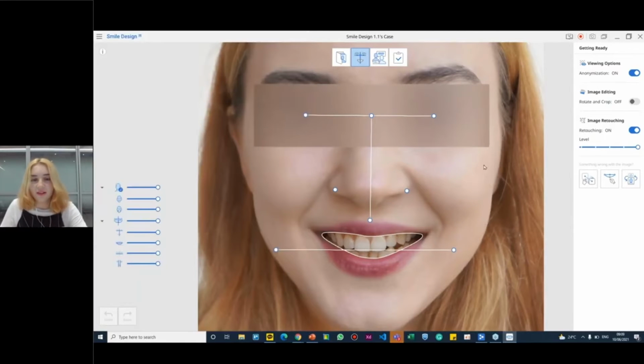I love this concept just because it is about presentation on behalf of the doctor showing the patient potential end results. I think it's really important to give them the best concept of what they could look like, as opposed to seeing flaws and such. Definitely, because smile design can basically show you your new life when you smile, and you want to make sure that you are confident and you look nice. And yeah, I really enjoy having this feature, even though it doesn't really cover all of my dark circles, but still, it's a nice addition. And the program also rotates the image and straightens it, so you don't have to do it.